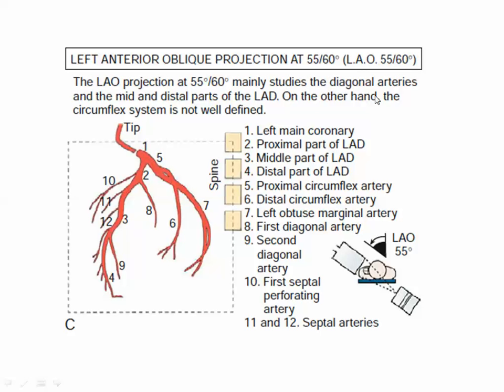What's this view? Yes, it's LAO because the spine is here, and you can put your hand this way, and the lips will directly meet, and here will be the shaft and the aorta just in front of the spine. Okay. So is it LAO cranial or caudal? Here is the diaphragm. So it's cranial. What are the walls? Septum, anterior, lateral, inferior.